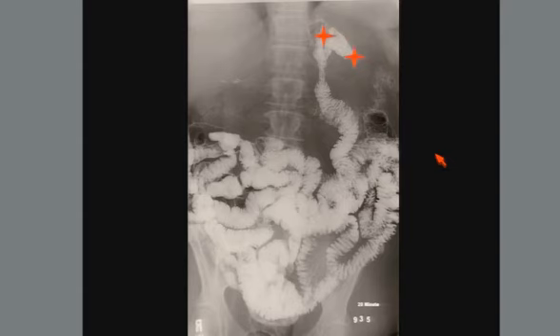The majority of the leaks do occur here, at least 75%. A small number occur here at the blind limb. And fortunately, very few leaks occur distally because this can be a difficult area to interrogate because of the overlapping bowel loops. This is a normal gastric bypass pouch, about 1 ounce. Here's the gastrojejunostomy. Again, this is the most important place to look for leak.